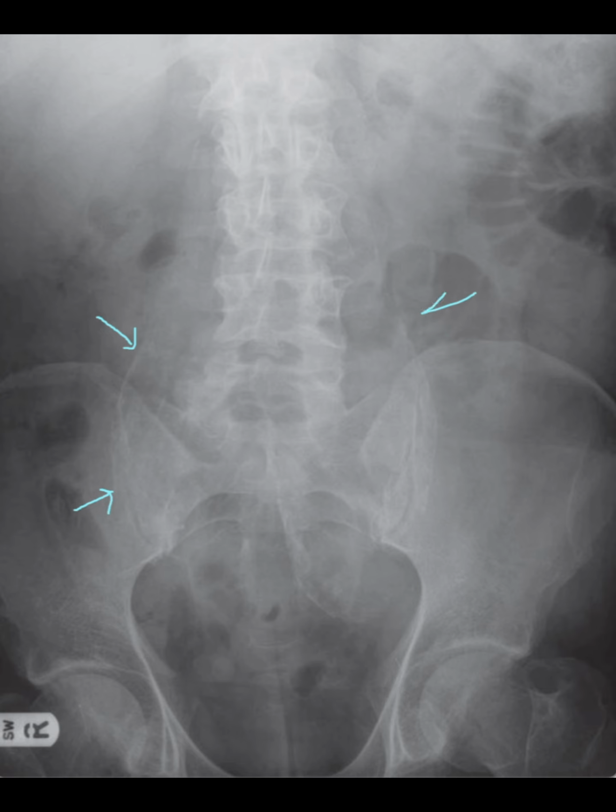For those interpreting similar cases, it's essential to recognize the different types of calcifications that can appear in the abdomen and pelvis. Common types include curvilinear, punctate, solid, and rounded calcifications. These may be associated with various conditions such as renal calculi, gallstones, or even metastatic diseases. When calcifications are widespread, it's important to consider metabolic disorders like renal failure, hyperparathyroidism, or diabetes as potential underlying causes. A differential diagnosis should always be broad.